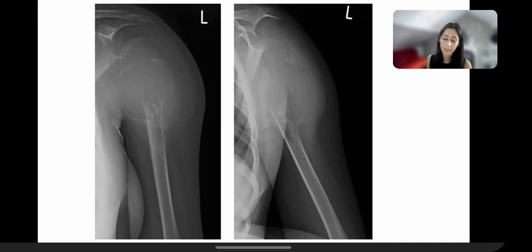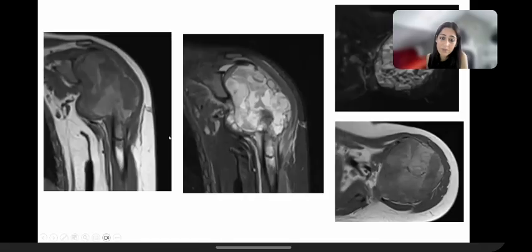So the tumor has gone crazy. You don't have to tell me what this is. This is the tumor gone berserk. This is a very aggressive, destructive process, which has completely eaten up the proximal humerus involving the humeral head, neck, and the proximal diaphysis with this permeative pattern of bone destruction. On the MR, again, you can appreciate the large extraosseous component, multi-compartment, multi-septated, and you have these multiple fluid levels. So you know that the working differential diagnosis for this case was a telangiectatic osteosarcoma.